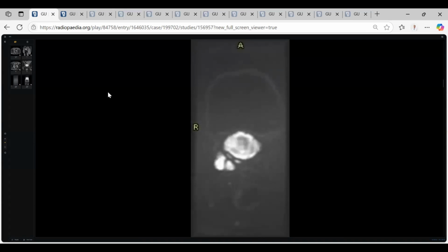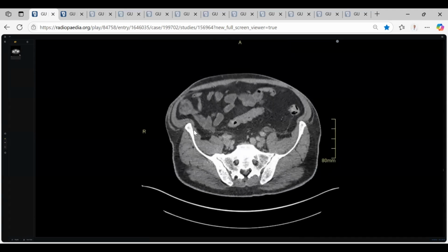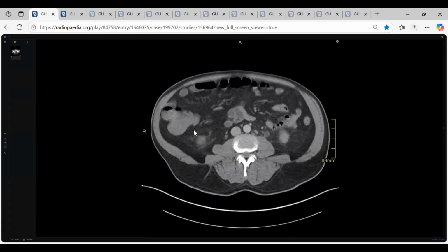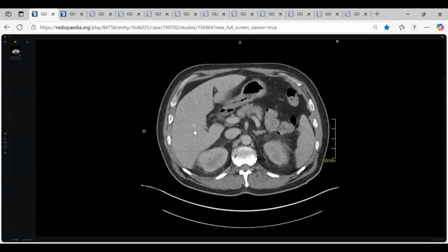Okay, thank you, doctor, so much. It is a very nice case. Look, my colleagues, this is a diffusion. This is the prostate. This is the abscess, and this is another abscess here. And then this is the seminal vesicles. Marked restriction. If we compare with the ADC, you will see low ADC values. This is a very good case scenario. All of us will concentrate here, but look here, there is another disaster: a left dilated ureter with thick enhancing wall, surrounded by smudged periureteric fat, and complicated by left hydronephrosis and pyelonephritis.